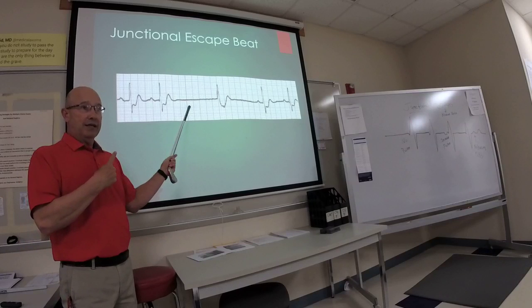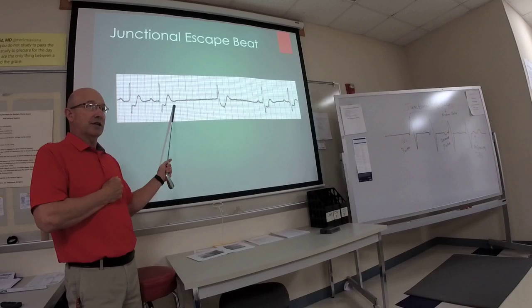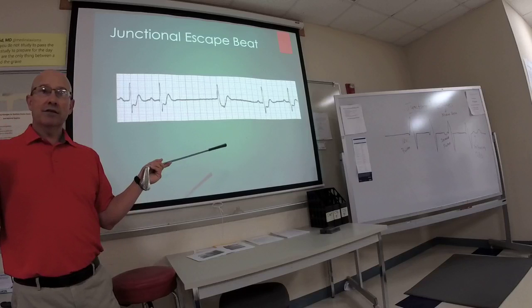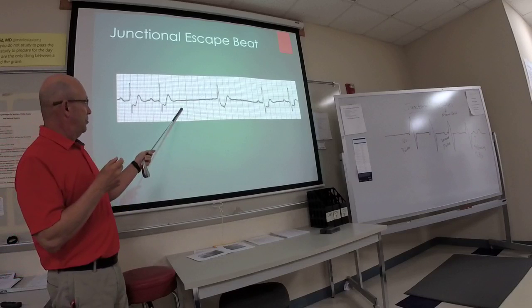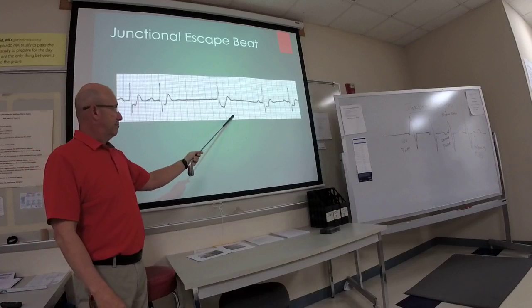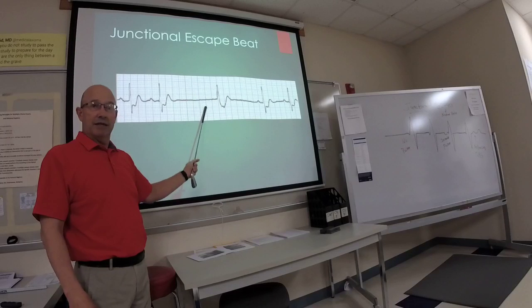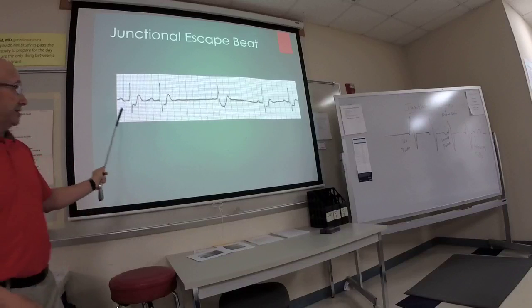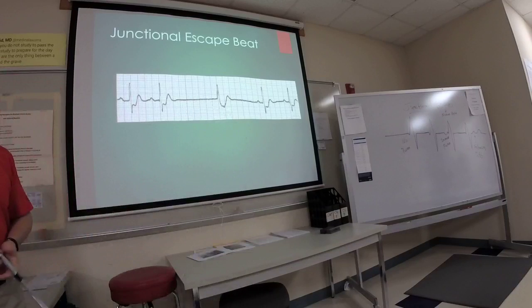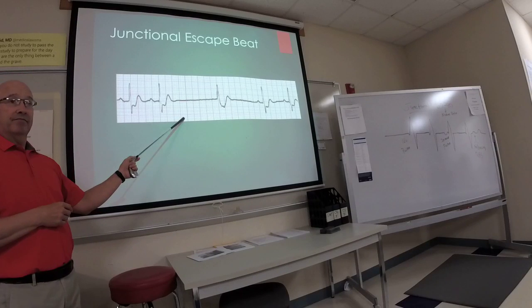Eventually, more than likely, it's going to be a trip to the cath lab to figure out what's wrong with this patient. Anybody want to be a cardiologist? They call you in. They say, "What's wrong with Bob? He keeps having these sinus pauses, but with this junctional escape beat right here." If this happens over and over, what is this going to do to your patient?